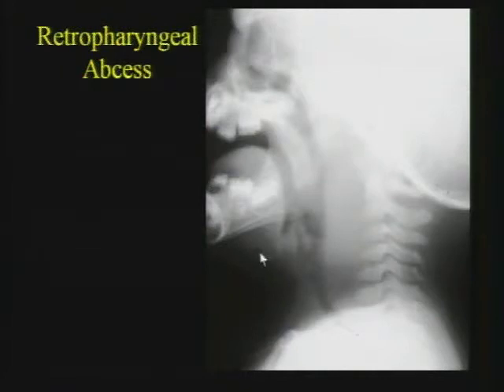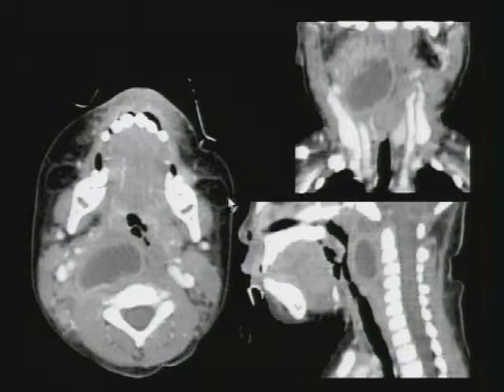And moving along, as we're coming down the nasopharynx, you can see that the soft tissue in the retropharyngeal or prevertebral space is too thick. And if you were sure that this was taken properly and in inspiration with as much extension as possible, you would suspect that there was an underlying lesion, in this case, retropharyngeal abscess. Most of the time now we do a CT scan to help the surgeons decide whether to drain it and where to drain the lesion. And here you can see the retropharyngeal abscess with rim enhancement seen on both the axial, coronal, and sagittal reformations.